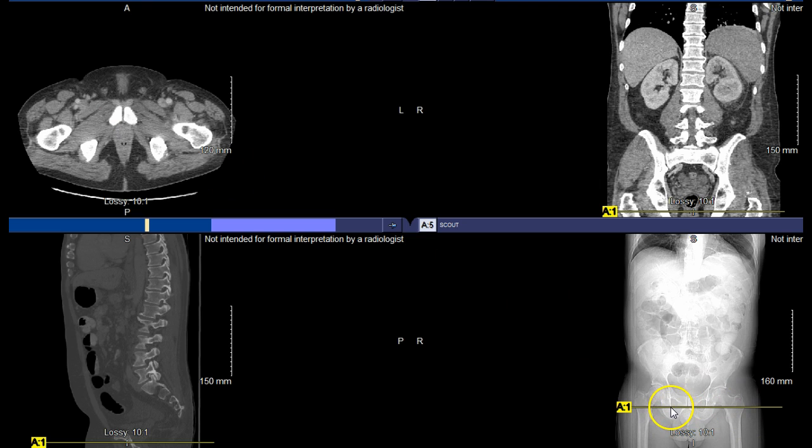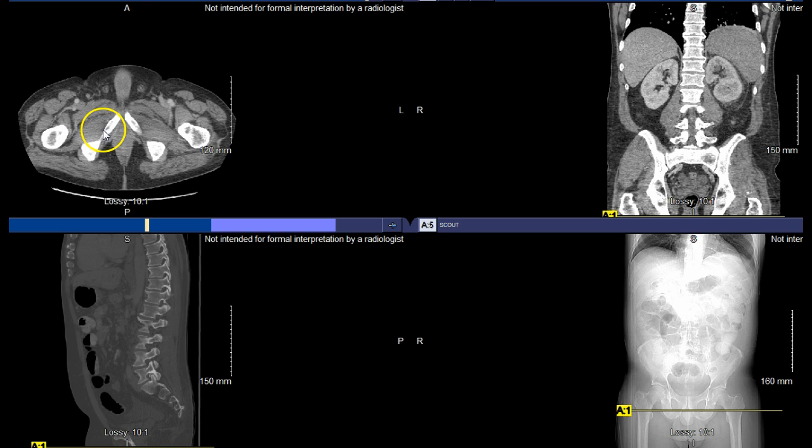If we look on our localizer and see where we're at, you can say, all right, that has a space right there. So what you're seeing is the region of the obturator foramen. It's just that the opening is there. So you can see that connection down here in the inferior aspect, some more of the anatomy truly associated with the ischium.